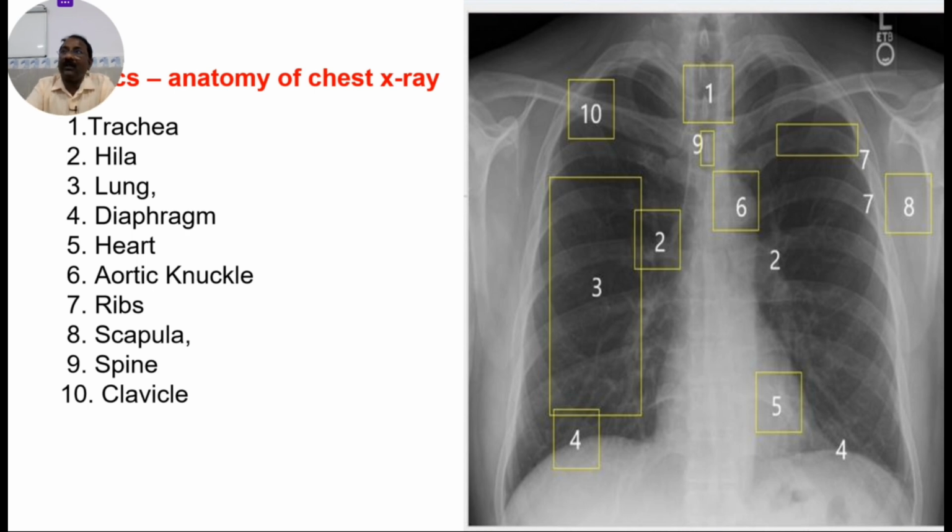When you are postulating rheumatic heart disease, mostly mitral stenosis and mitral regurgitation, then you can see the left atrial appendage to know whether the person is having a massive left atrial enlargement or not. In pericardial effusions, which we often see, maybe because of extrapulmonary tuberculosis, you can find the pericardial effusion and you can see the bottle-shaped heart.